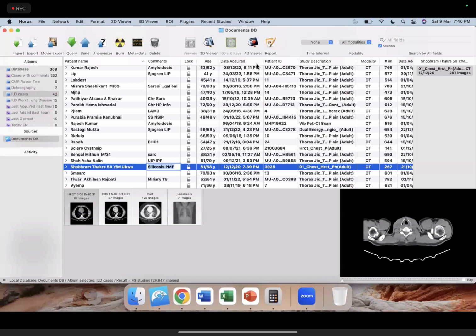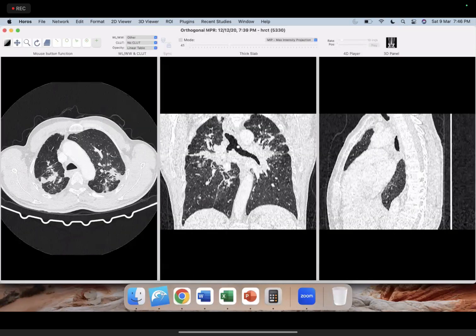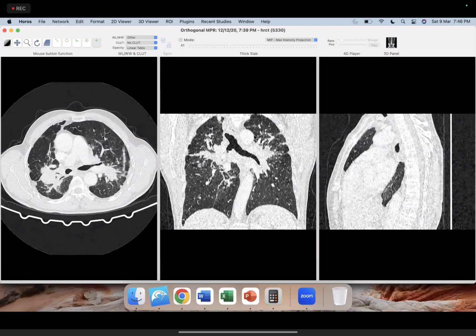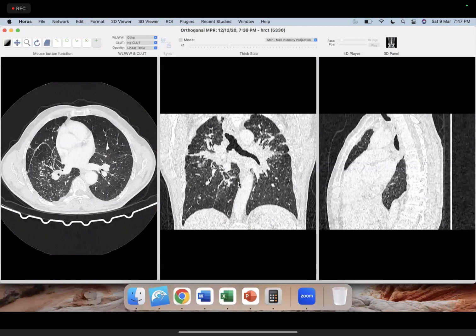Sorry, here you can see the details. Okay. So what do we think of this? So this is again fibrosing or non-fibrosing? Okay, so people are calling fibrosing because this looks like fibrosis. This is actually not fibrosis per se. Remember, these are bronchocentric mass-like lesions, and we will discuss in some time before we make the diagnosis. I mean, first we make the diagnosis.